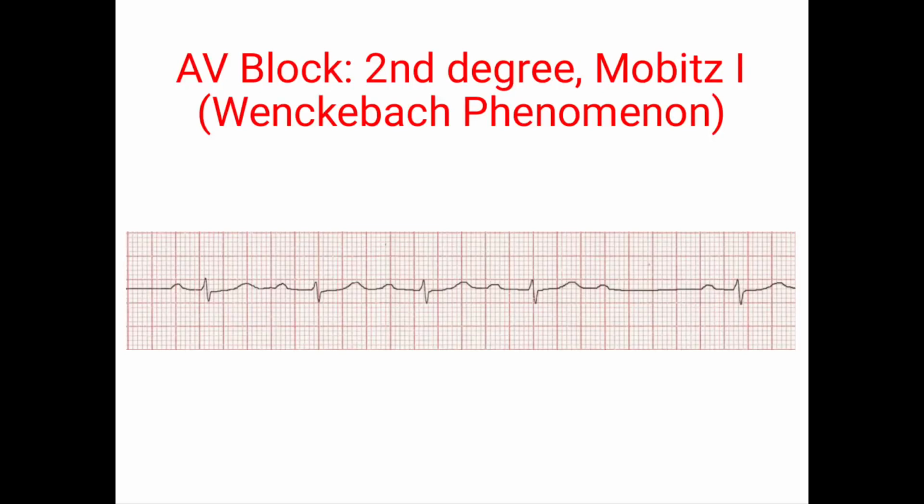Hi friends, in this ECG basic, today I will talk about second degree heart block, which is also called Wenckebach's phenomena or Mobitz type 1 second degree heart block.